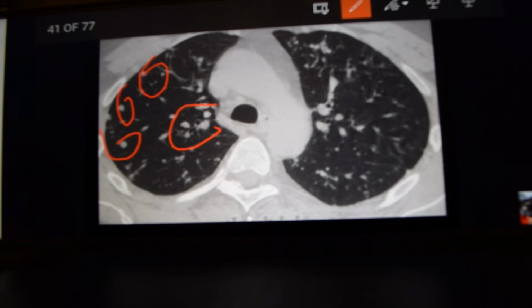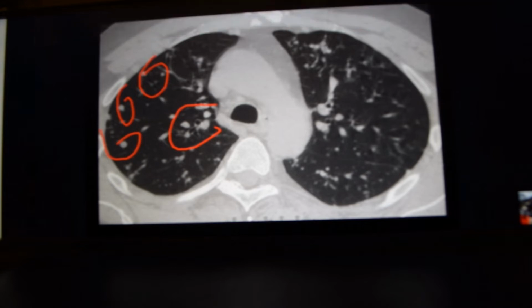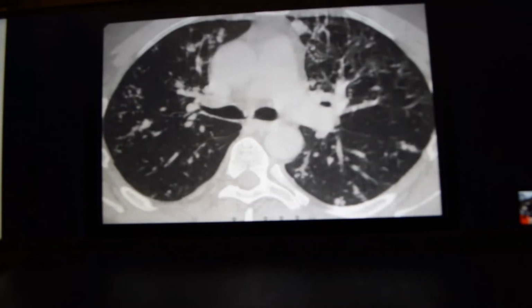Random or perivascular nodules have a similar subpleural distribution but show a uniform and diffuse distribution. They do not cluster. They are the result of hematogenous dissemination and are characteristically found in miliary tuberculosis, in fungal diseases, and in metastatic spread and in septic embolization. So these are the classical picture of random hematogenous perivascular nodules.